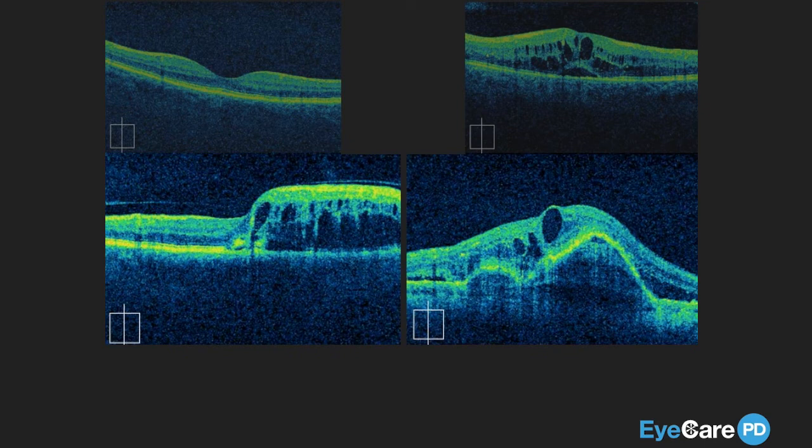Here, you've got an example of 2 different cases. On the left, a case of a retinal vein occlusion, and on the right, a case of wet AMD. If you're able to know that with diagnostic certainty by simply looking at the OCT, meaning on the left, the patient with retinal vein occlusion, looking at the diffuse outer retinal thickening and that spread of intraretinal fluid, and you know that on the right, you've got this patient with pigment epithelial detachment, subretinal hyperreflective material, subretinal fluid, and intraretinal fluid, you know that constellation of signs is indicative of wet AMD.